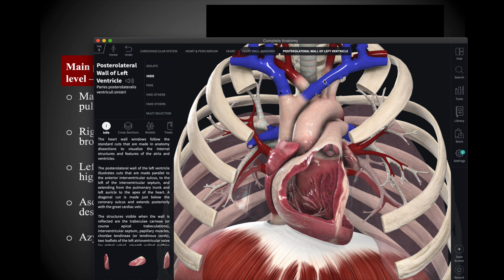And so if we get some of the aorta out of our way here just for a moment so we can see it a little bit better, here I think again you can sort of note the height, so to speak, of the left pulmonary artery compared to the right. You can see how the left is clearly slightly higher than the right. And so again, that's why at the main pulmonary artery level, you're going to see more of the left pulmonary artery than the right. So keep that in mind when you're viewing this level of the thorax.